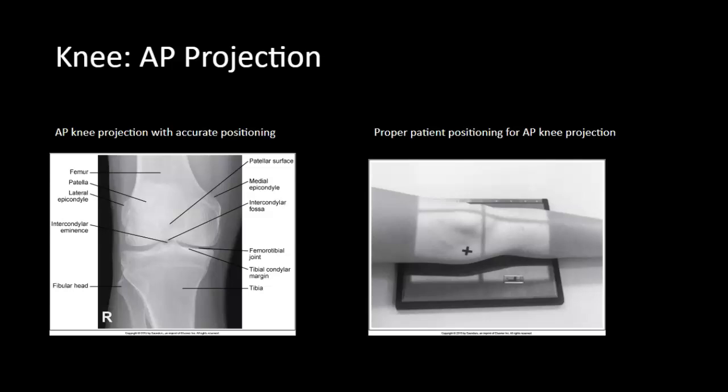The femoral tibial joint space should be demonstrated as open. Anterior and posterior tibial margins are aligned. The fibular head is half an inch distal to the tibial plateau. The knee joint, or femoral tibial joint, is at the center of the exposure field. 1/4 of the distal femur and proximal lower leg and the surrounding knee soft tissue are to be included within the exposure field.